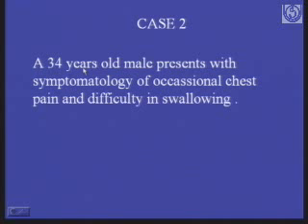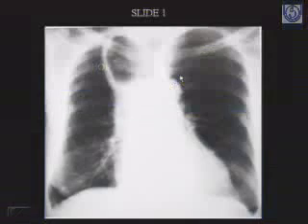This is a 34-year-old male patient who presented to the casualty department with symptoms of occasional chest pain and difficulty in swallowing. This was a skiagram which was taken for the patient, and he was referred to the Department of Radiology for further clarification.